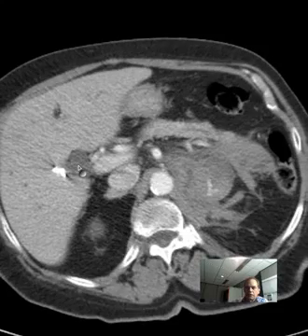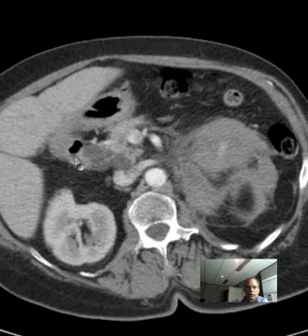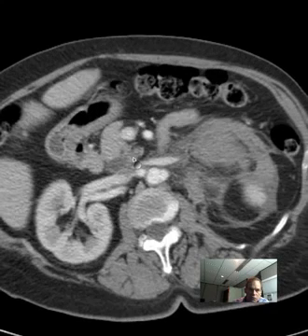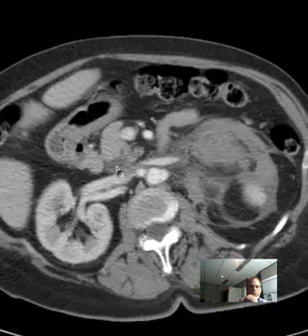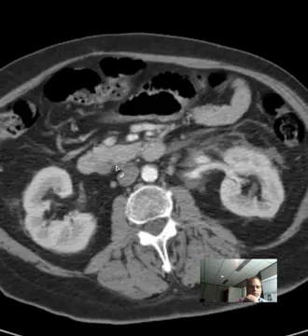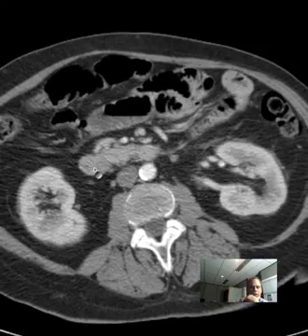A patient had the gallbladder out, and here you can see the common bile duct going toward the pancreas through the head of the pancreas, which is not real well demonstrated here, but this is the head of the pancreas here, and the distal common bile duct should be emptying out into the duodenum, which is right here.